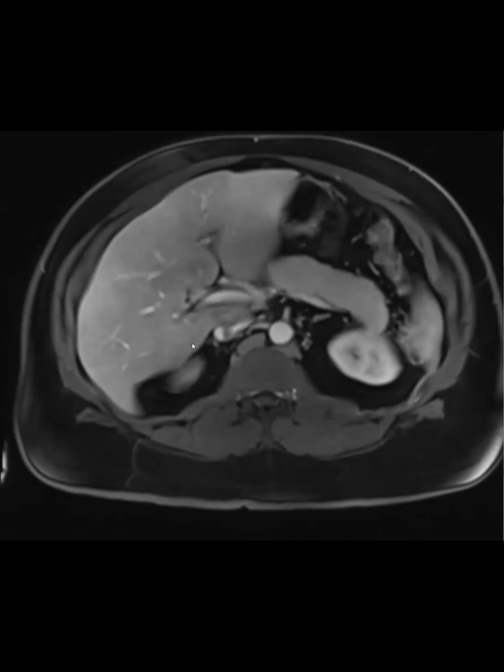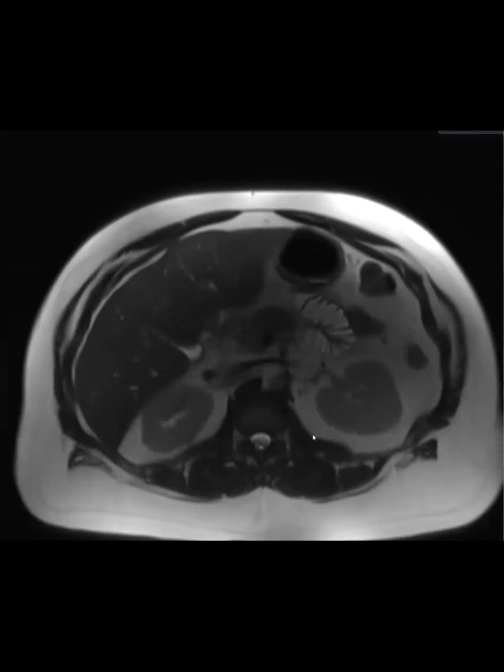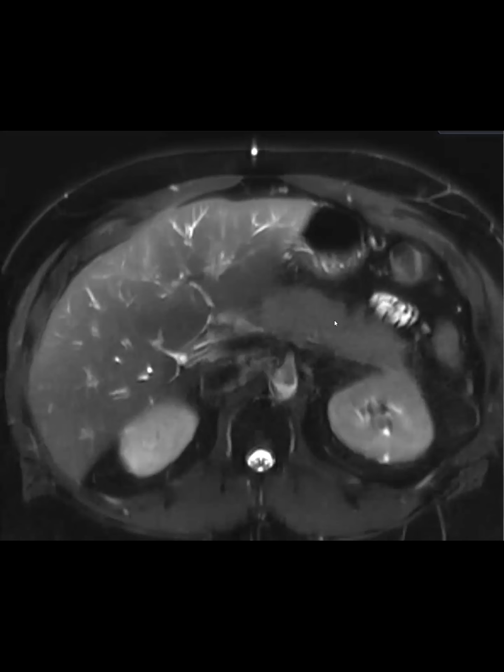Are you pointing towards the pancreas, that it looks too smooth? Yeah, so what do you think? IgG4. Yes, exactly. This was a sausagey pancreas. We've lost the normal lobulated appearance. We have sclerosing cholangitis, and then they checked their serum. Sometimes in IgG4 you can also get beading of the duct. In this case, the pancreas just looked completely sausagey and featureless. So putting these together, this was IgG4.